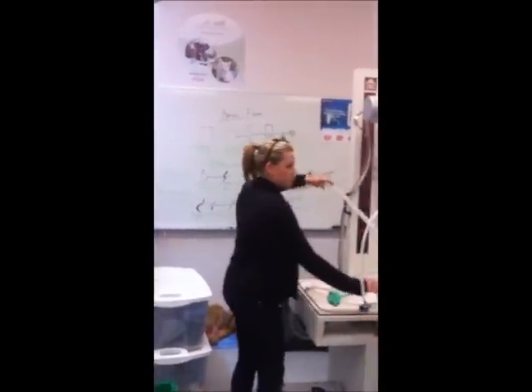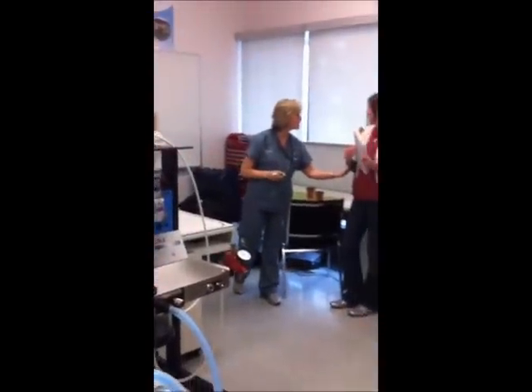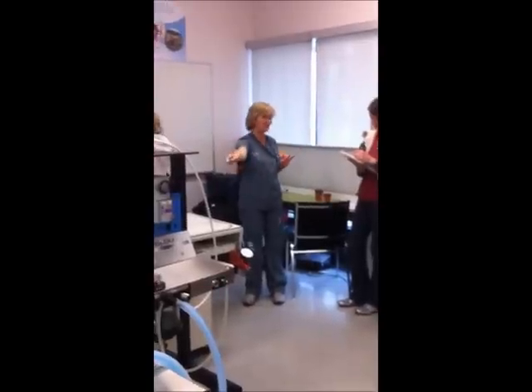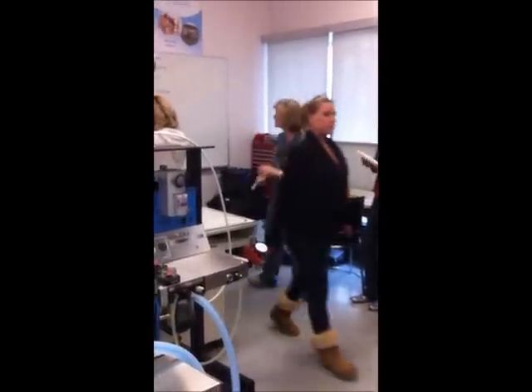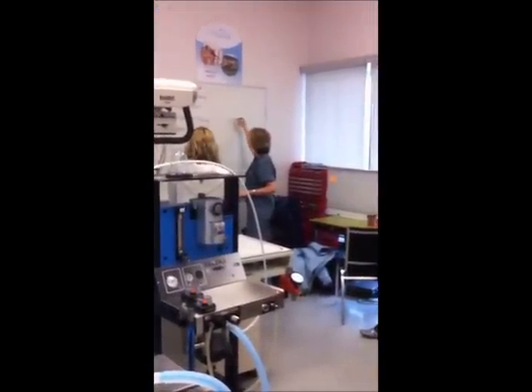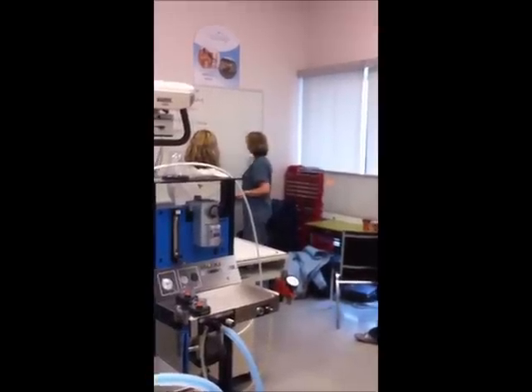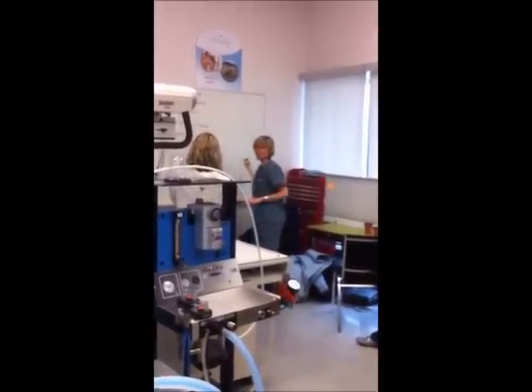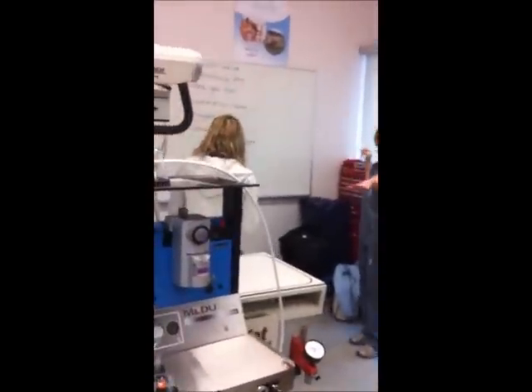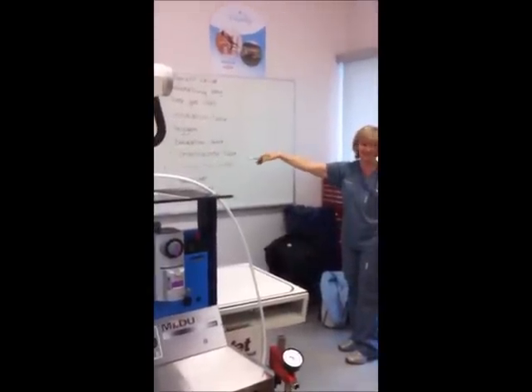Can I show you something else just before you go, because I think it will be helpful to you? There is a schematic on the test, which is kind of like a stick figure drawing of that machine. I'll tell you already, it looks more like something like this. There's usually like a square, and then a circle, and then whatever, and then it comes off, and it goes like that, and this is in there. This is what you're going to see on the written test, which is a little bit hard to translate from when you're looking at this, or even our wonderful drawing here that Carol has created.